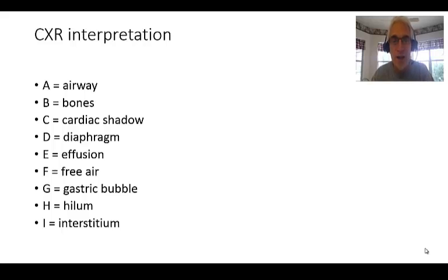H hilum. I interstitium. It provides a systematic way of looking at chest x-rays so that you can learn to identify normal and abnormal. And that way, you'll be much more comfortable if you do this every time with every chest x-ray that you have.